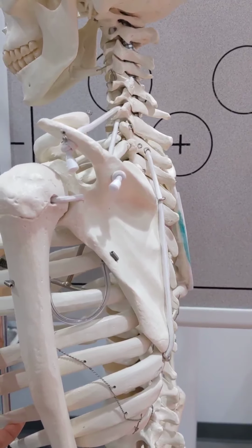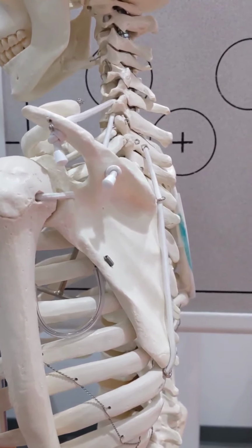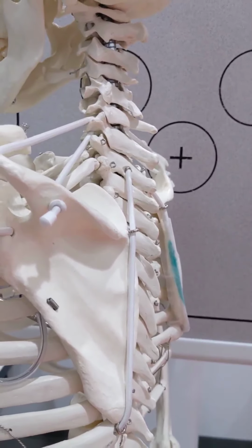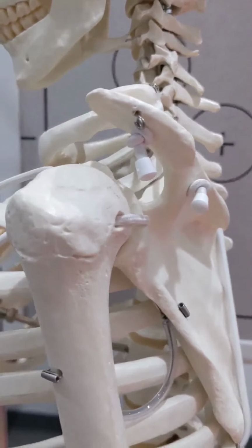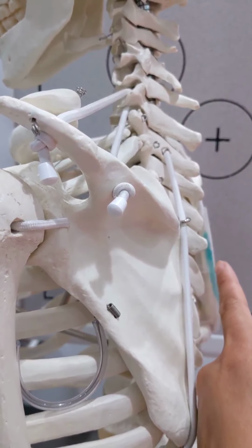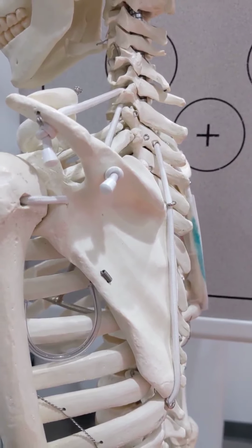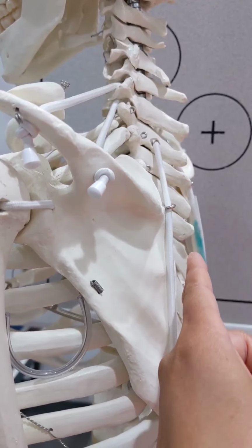So this means that we're getting closer to the lateral position. Okay, so in this position, we went from optimal, and you can see where the medial and the lateral border is just behind it. If we over-rotate, you'll start to see that the medial border, I'll just bring this guy to rest so I can put my finger there, you'll start to see that the medial border is here, and that the lateral border is actually on this side this time. So in this position, over rotation, closer to lateral, the lateral border of the scapula would be closer to the ribs than the medial border.